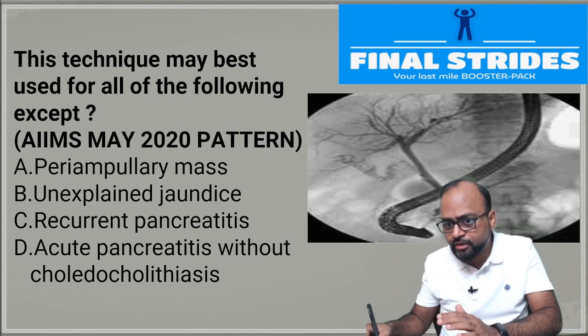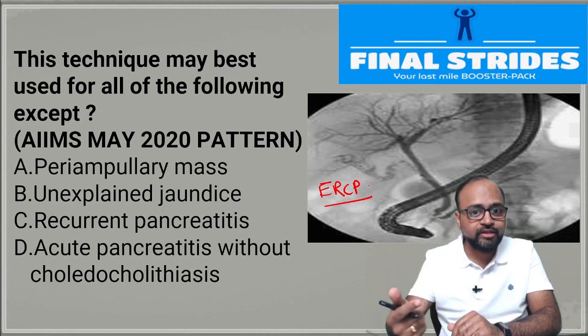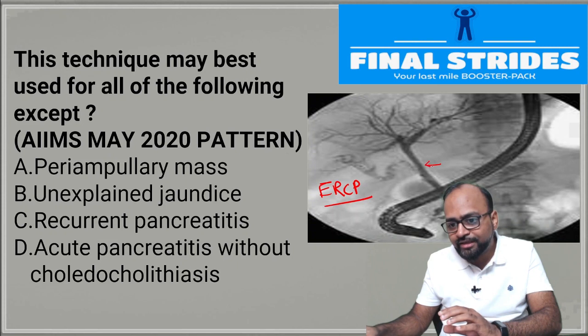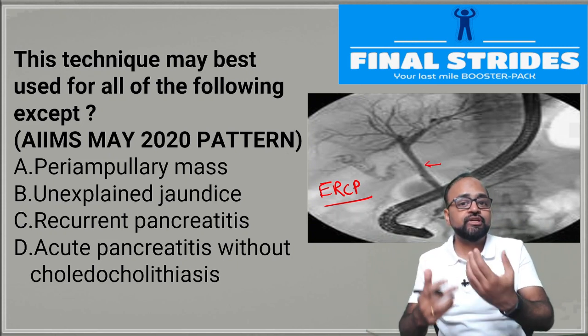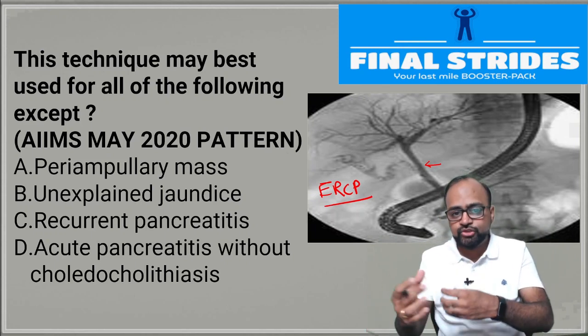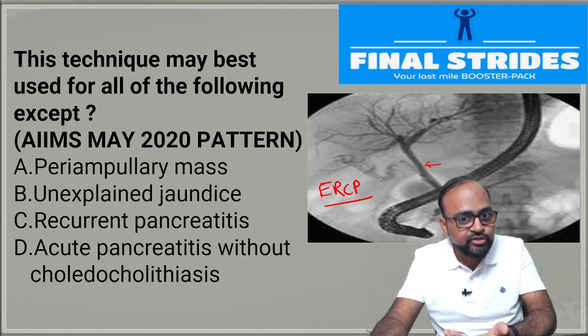So look at this image now. This is how an ERCP image looks. It is usually an inverted image, so you can see that the contrast material is actually appearing black here. It doesn't matter whether it appears black or white. Remember, it is just like a positive and a negative film. These are digital techniques of depicting the data, but they will show you the biliary tree. That is what is important.